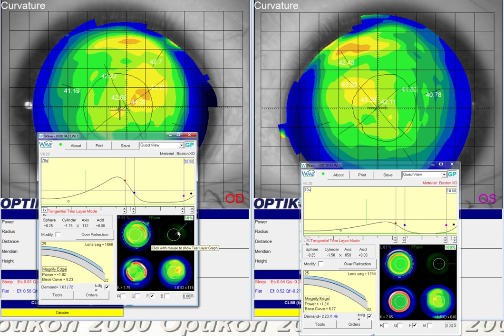In this meridian where we want to have more of the molding, we'll need a differential. And what I normally do is calculate about 1.5 times the amount of cylinder we want to correct. So we'll aim for a differential of between 2.5 to 2 3/4 diopters.